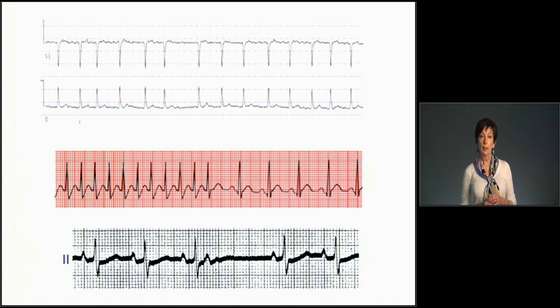And the last one begins with 3 sinus beats, followed by a non-conducted PAC. Remember, the most common cause of a pause is a non-conducted PAC.